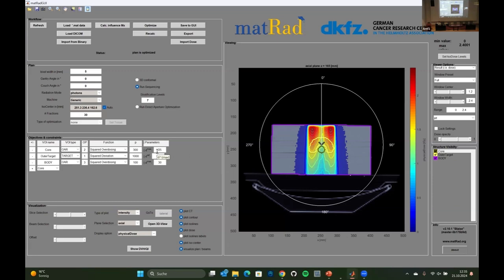So basically, how did the optimizer end up with this decision? In this one beam that you have opened, it could also have decided not to go so high in these regions. If you look at the units, it's 2.3 gray per fraction, while in the tumor here we have only 1.7 gray per fraction. So we could also have not allowed it to go as high. It could have stayed lower. And this is where the whole prescription and these mathematical functions come in.